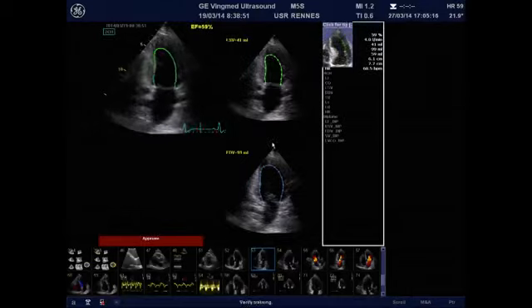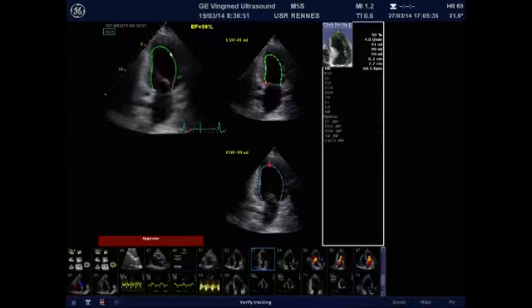And we get an ejection fraction probably overestimated in that case, because the delineation in the two-chamber view is not completely perfect, because we miss something here. So we have to start by the manual assessment, and sometimes we can use also the automatic method, but we have to make sure that the automatic tracing of the endocardium is perfect, which is not the case here.